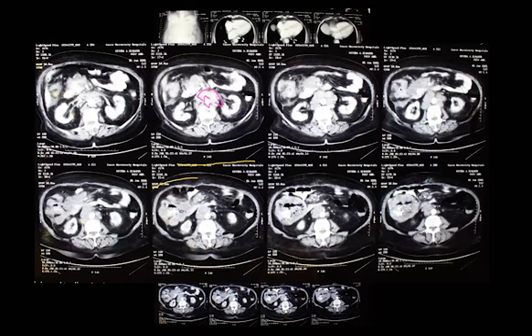I don't know what this could be. No, just think, describe them. You don't want to diagnose at the beginning. You want to describe them, and then when you describe them, the diagnosis will be very clear. The problem is that you want to know what's going to happen to you throughout your life when you cannot know that at all. But if you take steps, your pathway keeps appearing. Otherwise, you cannot see your pathway. You have to take the first step. The first step here is just describe.